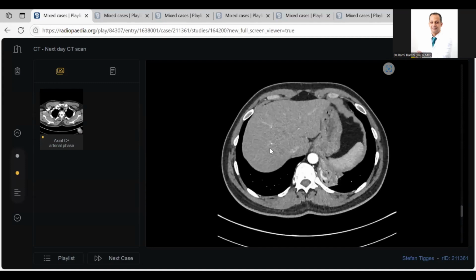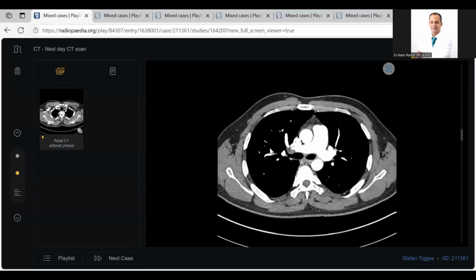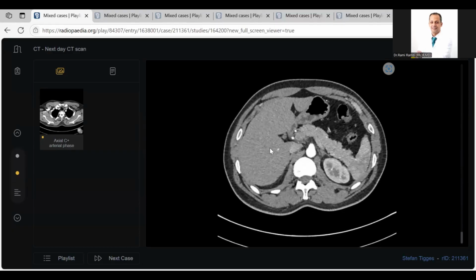My colleagues, this is an arterial phase. We should also follow the venous phase to detect the venous return, whether it is systemic or intracardiac, directly through the pulmonary veins. Thank you so much. It was a very difficult case. Thank you. Welcome. Next candidate.